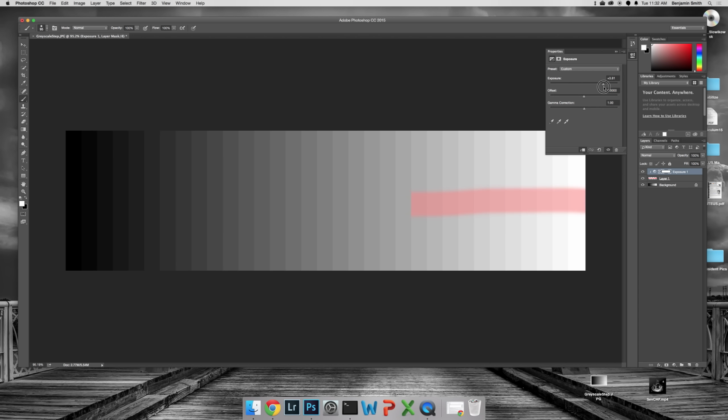So let's say I'm looking at an ultrasound of the heart and I just want to colorize the myocardium. So now I'm just selectively colorizing this bright white areas and nothing in the black. So this is going to be like your lumen of the LV over here on the left side of the screen, and the myocardium is on the right side of the screen. And so what I can do then is, let's say this color just isn't perfect for me, so I'm going to leave the exposure there because it's colorizing the correct spot.